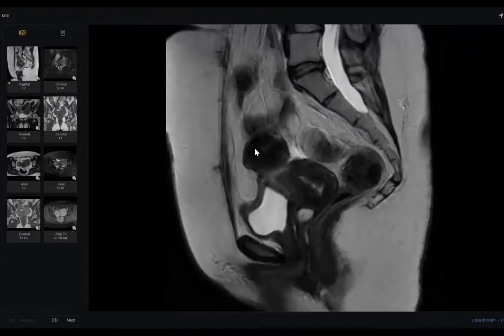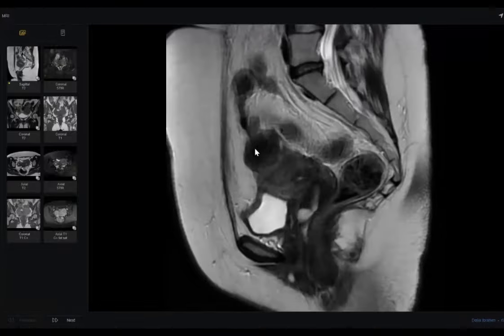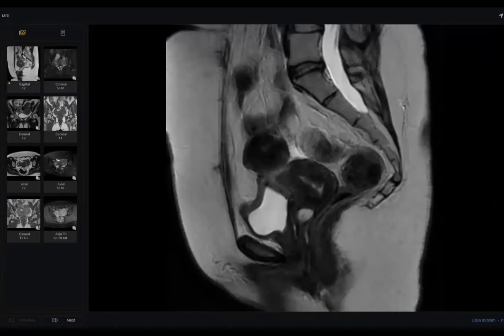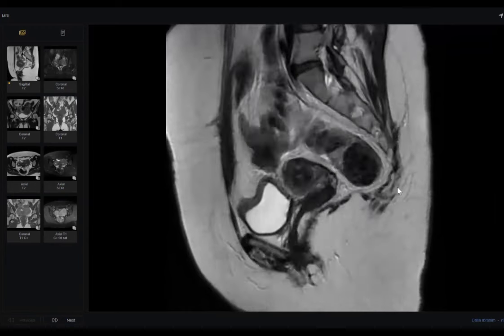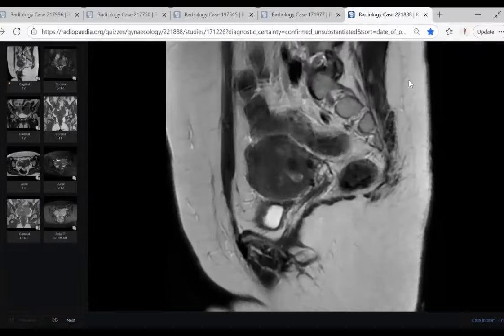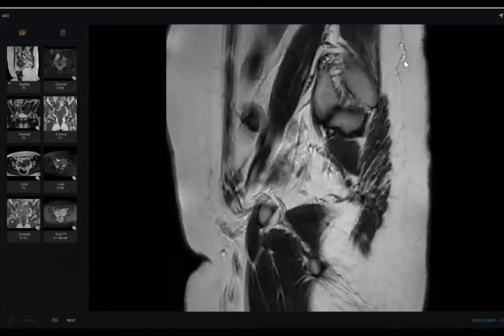What happened here? This thing? Yes, here in this slide. It is not bowel, right? Don't scroll. Okay, like this. So it is a T2 hypointense lesion epicentered upon the fundus of the uterus. My prime differential will be fundal fibroid. Thank you so much.